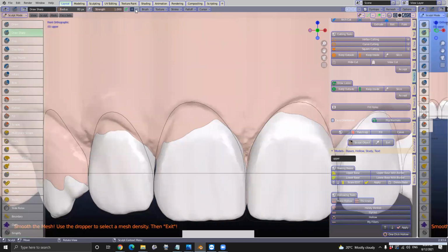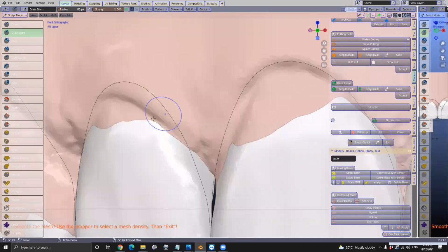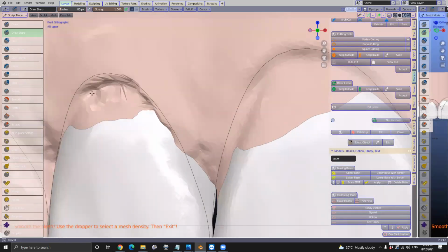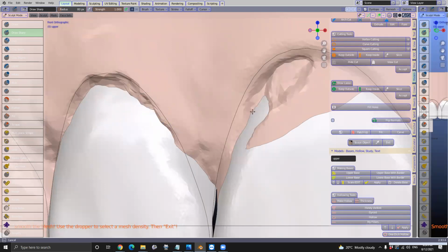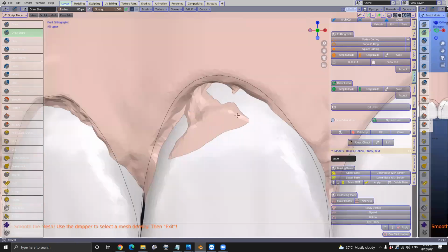If you take a measure of that gum that you're actually pushing to the side, what would that be, just out of a matter of interest? What is that, Will? You could take a measure of that section that you're actually adjusting now, by just using a measure it tool, can't you? Yeah, you could measure it beforehand before we do it, and then decide how much there's going to be.